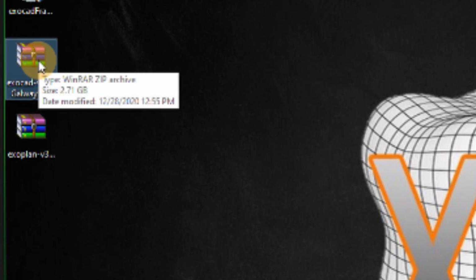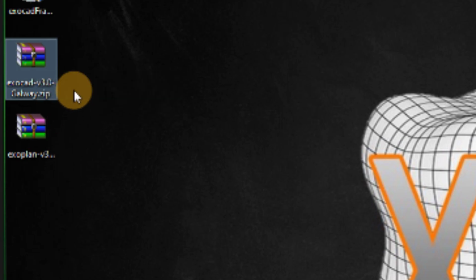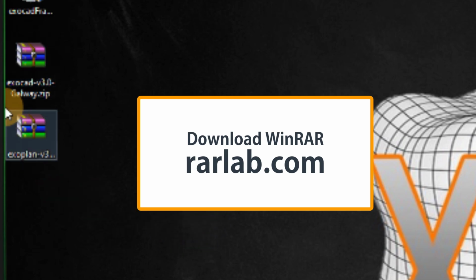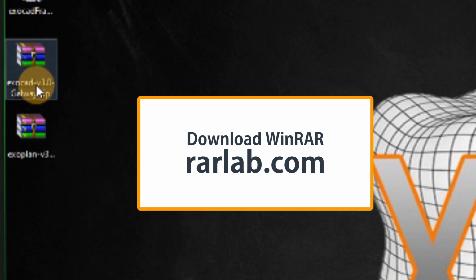If you don't have an unzip program, I would recommend downloading WinRAR, W-I-N-R-A-R. It's a free download, and it can decompress zip files as well as 7Z files, which is what the original OEM link is for DentalCAD.